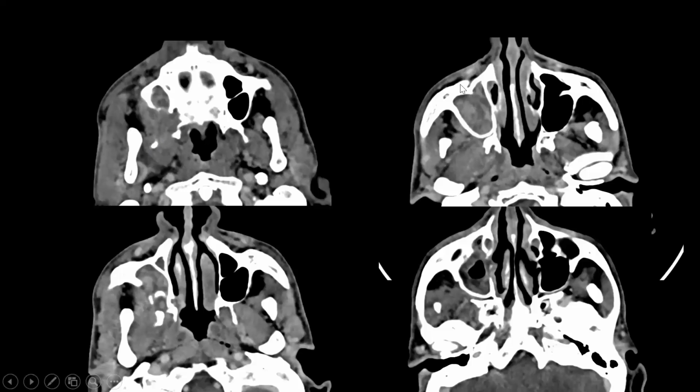I cannot see it. Higher up, supranotch ITF, there's soft tissue within the maxillary sinus and also in the retroantral fat region. So this is high ITF involvement. This is extensive disease, so the patient went into NACT. So these were all my CT cases.